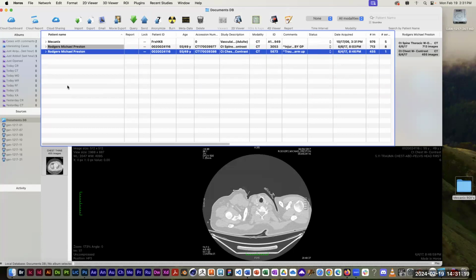All right. So that is just for your information. The other thing I want to do today, which is going to take up most of our time, and you'll have an exercise that I want you to do, is what's called segmentation. And I don't know, were you introduced to this? I know you said that you guys use Slicer a little bit with Glenn, right? Yeah, I mean, that's all we're going to do here. We're going to do a real brief thing. Some people really take segmentation to a very high level. I'll be honest, since I don't do 3D myself, I never use this except once a year when I give this demo. So forgive me if I screw something up, because it's not second nature the way like Illustrator or Photoshop would be. But I'll do my best.